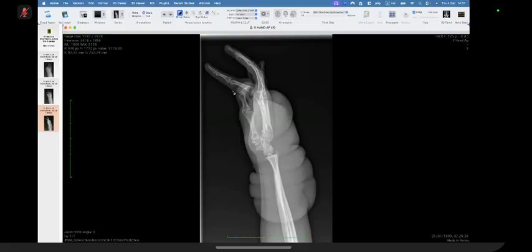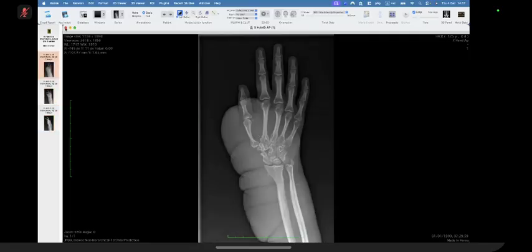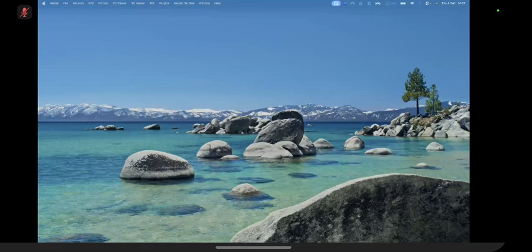Look at the soft tissue here. Look at the soft tissue there. There's nothing going on there, but this is completely abnormal. All right. The second case is actually also kind of like an Aunt Mini.